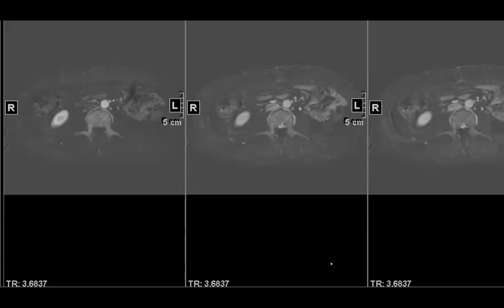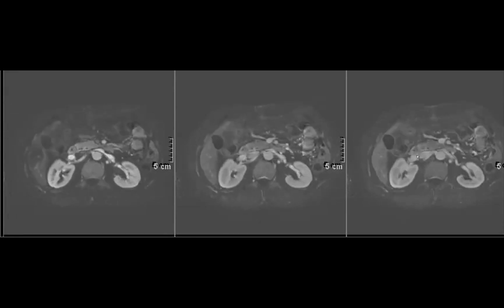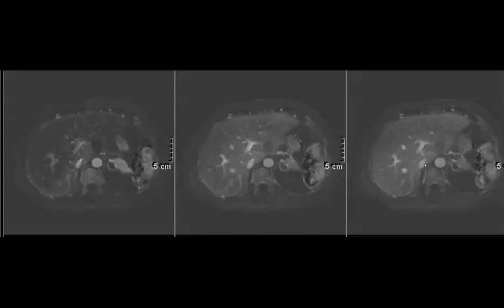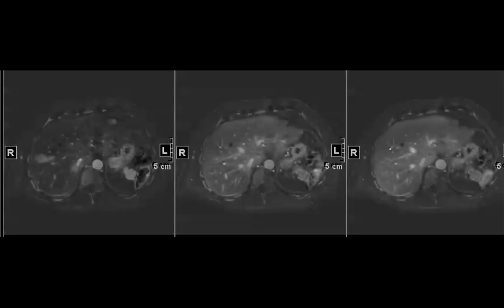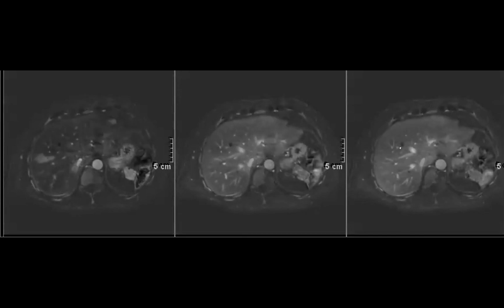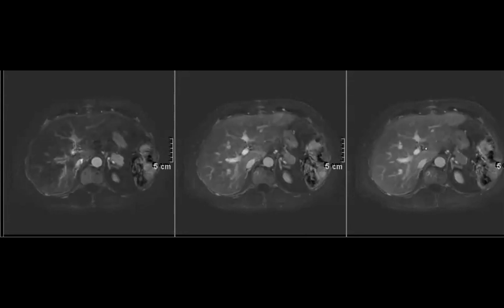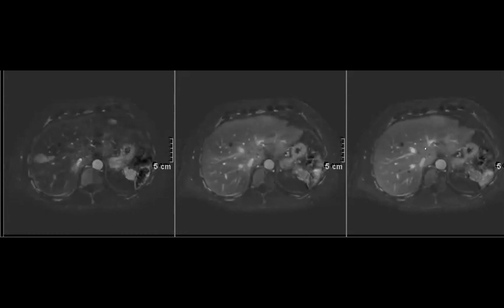I feel like the enhancement aspect is tricky. And to me, it seems neuroendocrine-esque, where if I see it on diffusion, I'm still really concerned, regardless of not being able to see it on T2 or post contrast. Like it's just blending in. No, but look, these actually have no enhancement. And only this one was showing restricted diffusion, and that's the one that had very bright signal on T1. So potentially this is restricted diffusion.